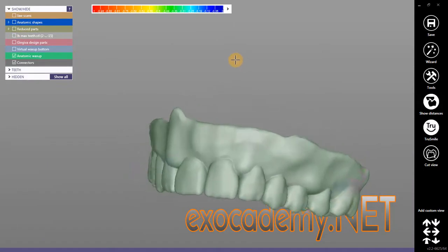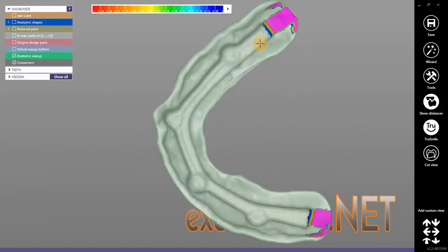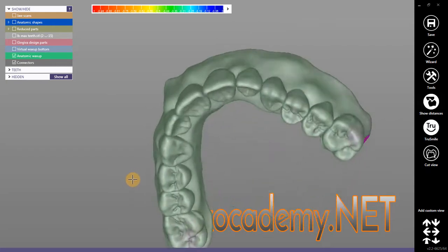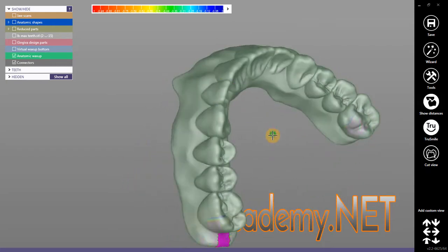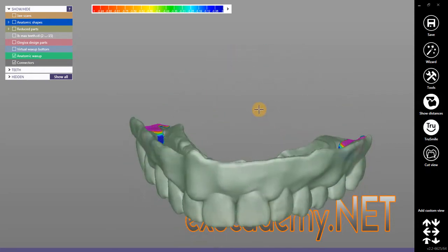But you can see when I remove the jaw scan, now the bar surface is on the tissue surface of what will be a PMMA temporary. So the bar surface will be cut out, and the teeth will be milled. I'm assuming that this is all going to be a single unit milled temporary prosthesis.